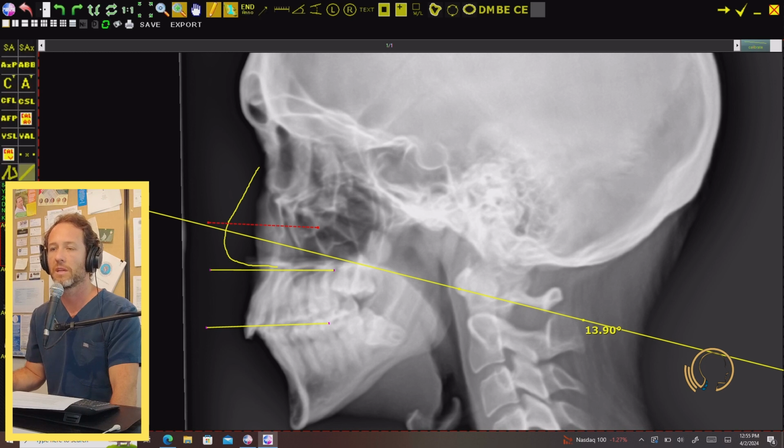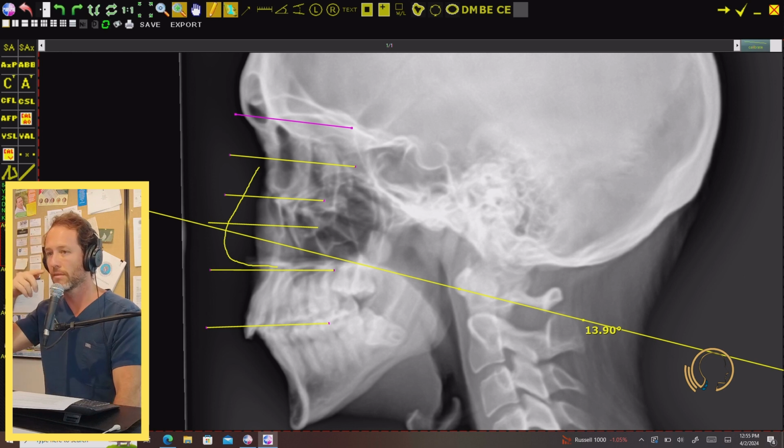Then the next 3 are going to be in reference to the ocular orbits. So S3, in the middle of the orbit. S4, S5 is kind of up like the eyebrow. And just in terms of looking at me on the screen, S0, right? S1, S2, S3, 4, 5.